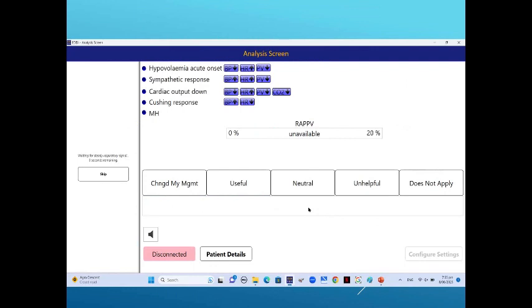Here is one of the first screens. On the left will be where the text alerts are printed. The initial message states that no analysis will start until there is a steady respiratory signal. It suppresses any analysis until the induction and intubation period are over. As we know, during this period, there are many very variable physiological changes.